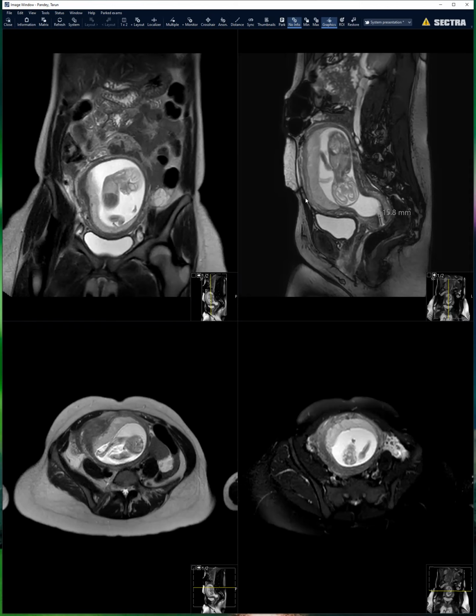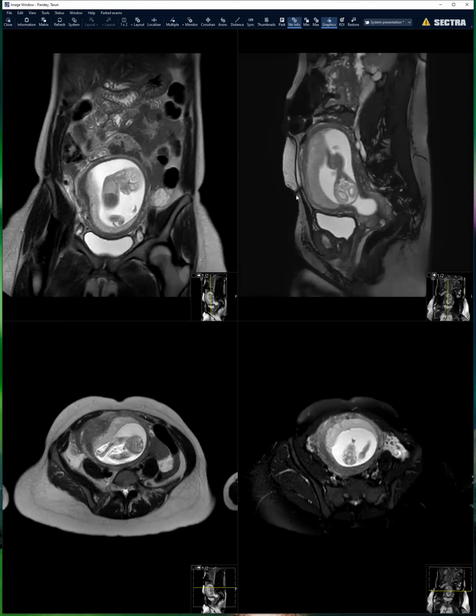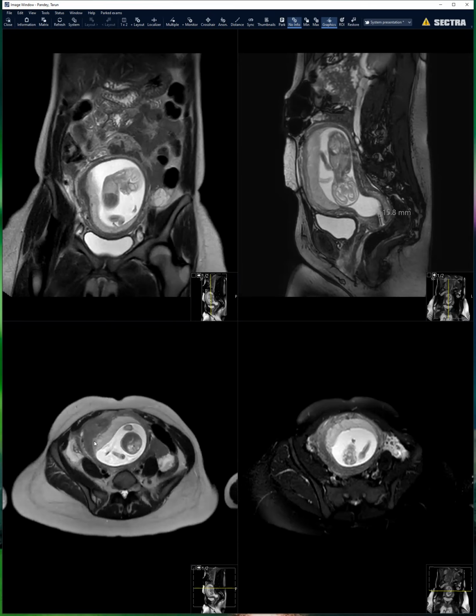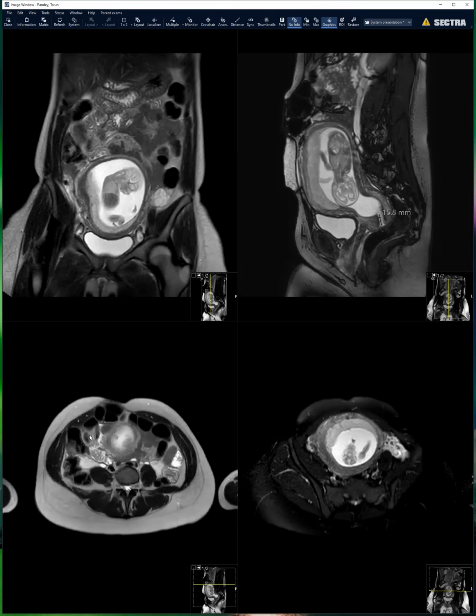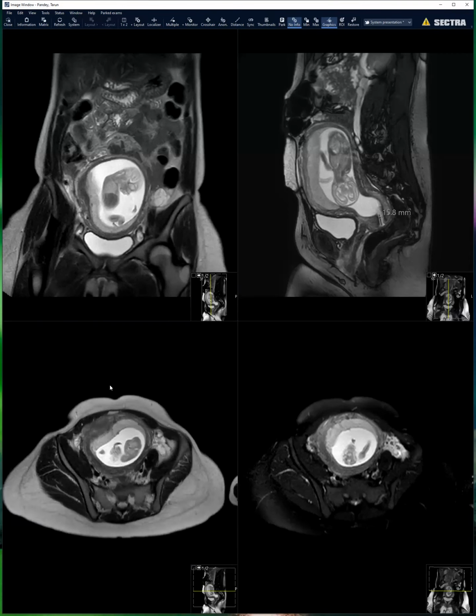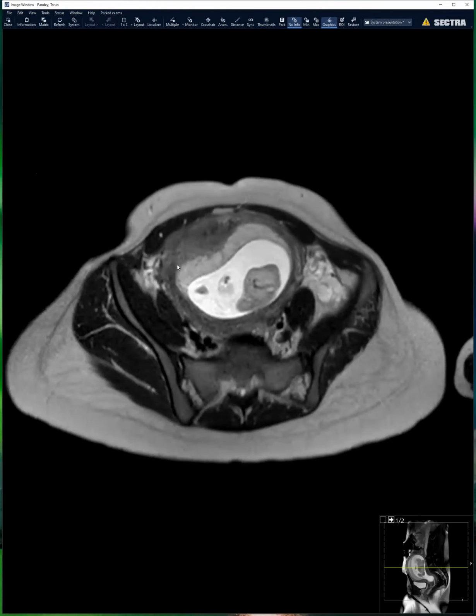I have a question about their myometrium, because under the placenta, in the bottom left corner, it looks almost like, is that a fibroid or a contraction? See how this myometrium looks? Yeah. I think there's probably a small fibroid, let's say. I'm not sure about it though.